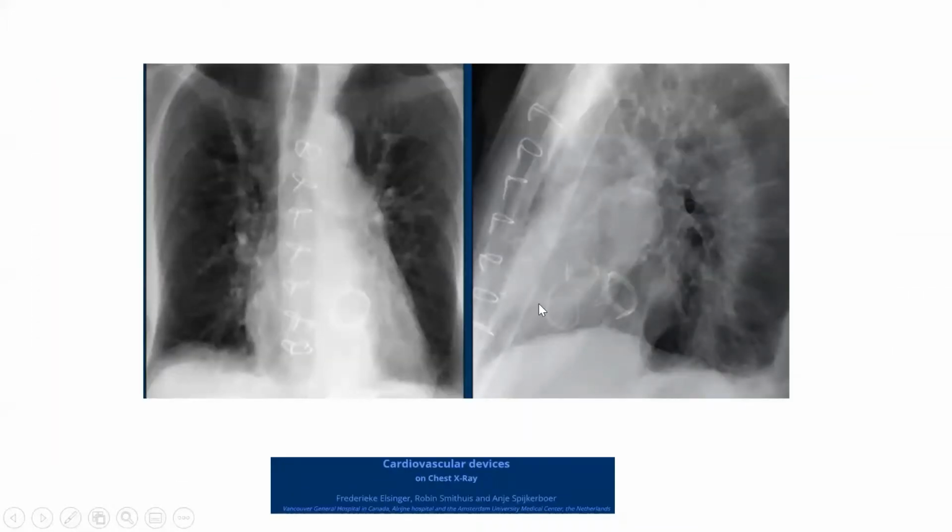Now, tell me, I need someone to take it. It's easy. What are these valves? You see, now the lateral usually separates the echo densities nicely, and you can see them better than PA view. But here I'm seeing 3 radio-opaque structures. This one, and this one. In the lateral, I'm seeing this one, and this one. So, anybody can take it?